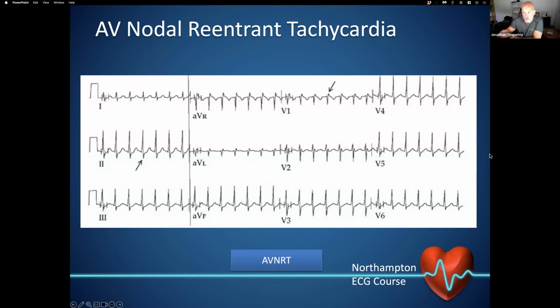It's very similar to an exercise test. When you do an exercise test, you can get ST depression in this immediate post-QRS phase, but that is not a marker. You do have to ignore that and go to 60 to 80 milliseconds before you make an assessment of whether there's any ST depression. Yeah, spot on. Brilliant. Good. So that's AV-nRT.